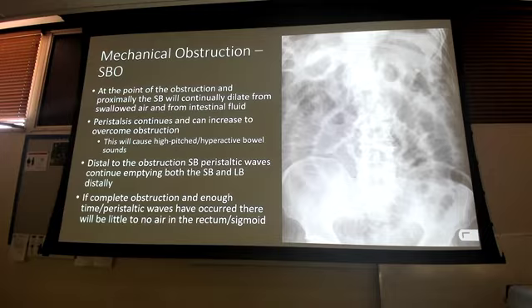That's leading me towards obstruction. Distal to the obstruction, it emptied the small bowel and large bowel. You can't really tell on this one, but there's not a whole lot of air, right? But the biggest thing is, have you been passing gas? When's the last time you used the bathroom? Well, I haven't been passing gas. I normally do. That's a concern for an obstruction.